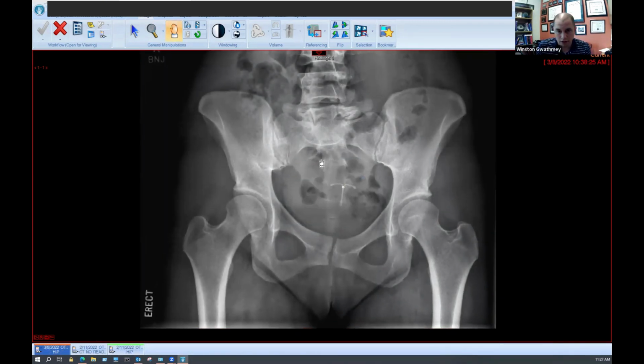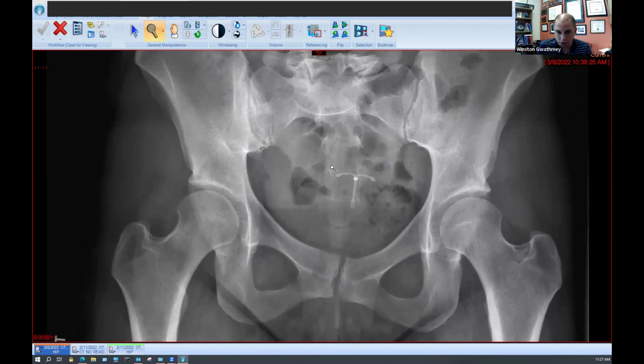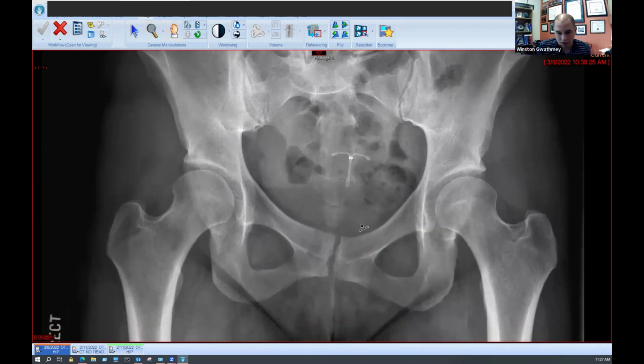All right, so I'm going to show a quick picture of a hip that's a little bit dysplastic, just so you get a sense of what you want to make sure you recognize and avoid. AP X-ray, not the best, tilted. As you can see, we're pretty tight here on the acetabulum, which in fact could undercall. If you think about it, when you tilt the hip back, it can sometimes undercall anterior coverage, okay? Now, that being said, there's still some numbers here we've got to look at real closely, okay?